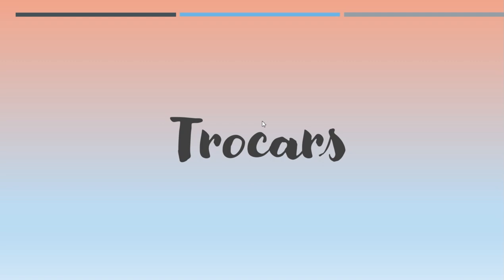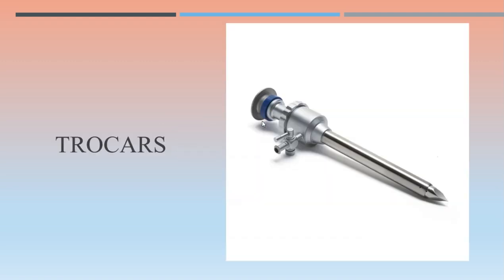Then finally, in the shafts, the trocars. Just to give you an idea, this is how the trocar looks. Here you can see this pointed portion, and this goes inside this outer sheath. This is known as the cannula, and this trocar comes up to this place. So the trocar is usually used with a cannula sheath, right?